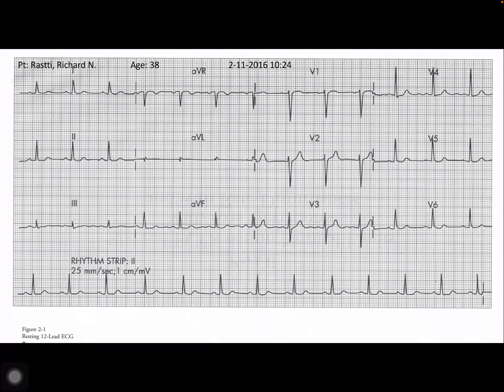Here we have another QRS complex that falls on the intermediate hatch mark. Here we're going to start counting, and then you can see that we have a beat that falls almost on 75 but is slightly shy of it. If one wished to split hairs, one could say that's half of one small box, representing something like 2.5, and instead of saying something absurd like 77.5, we could just say 78 is our estimated heart rate.